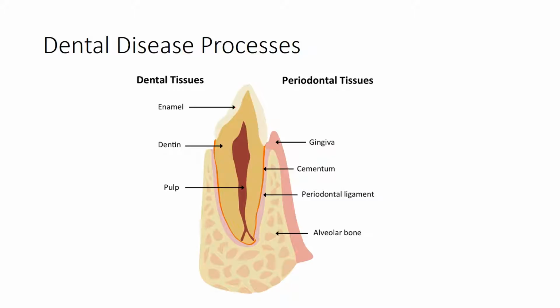And that's essentially periodontal disease. Obviously, this can be mild, and you can just have a little bit of bone loss. It can be moderate if it's in the middle of the root, and if it's in the apical third of the root, and the bone loss is all the way down here, then that's termed severe. So that's pretty much it. In summary, and this will help later with imaging, in decay, the bone loss is in the periapical region, and in periodontal disease, the bone loss is in the alveolar crest.